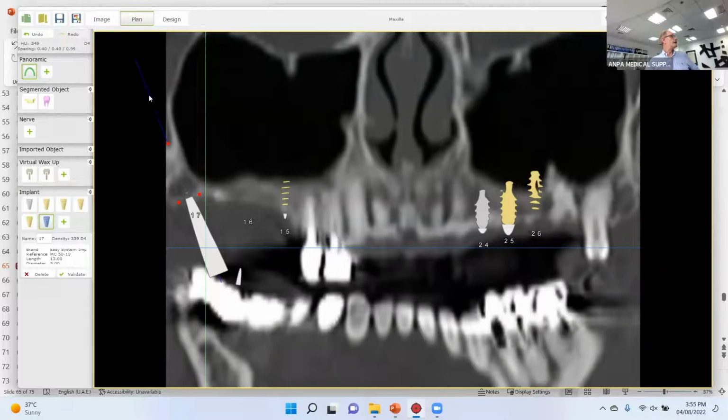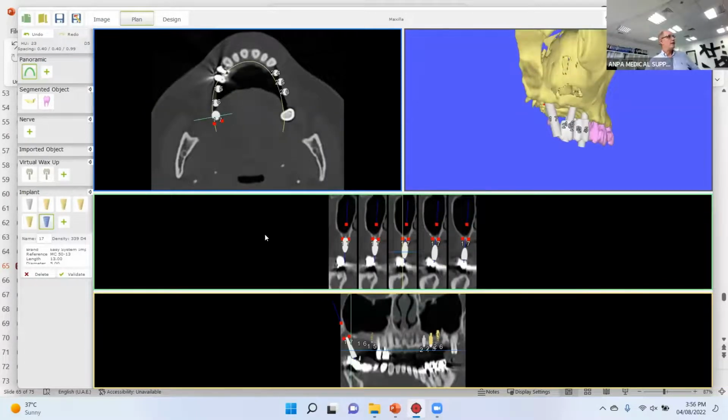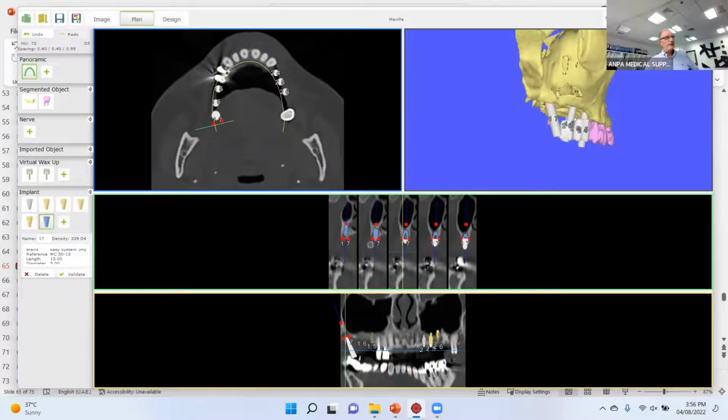This is not a typical case. It's just to show you. And you go in a different way here, and you see that the bone should be always inside that. So I'm inside the bone here, inside the bone, inside the bone. So all the way I am inside the bone. Okay, so this is very stable, and this is where to find them.